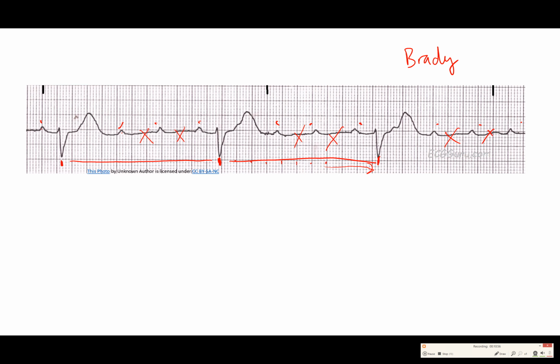And this one's going to be a little bit tricky, but we'll count it out here. It looks like this one is about 6 small boxes. This one is 7 small boxes, and this one is also 7, so no big change.